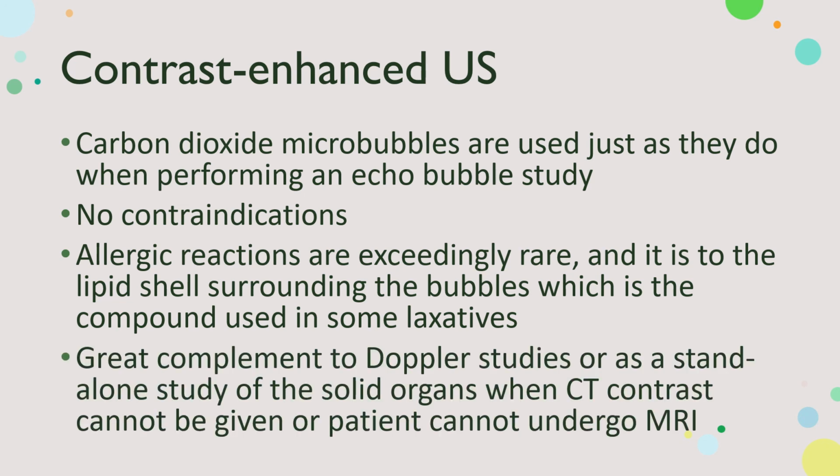And so this is a great complement to the Doppler studies that we're already doing. So we can add it to the Doppler, which is usually what we do for renal transplants, but it can also be used as a standalone study of the solid organs. And we've been using it a lot since we had this CT contrast shortage. And so the doctors are getting comfortable with using this.